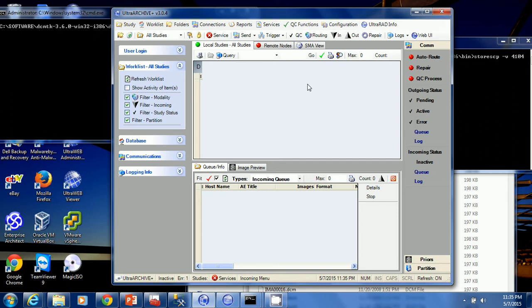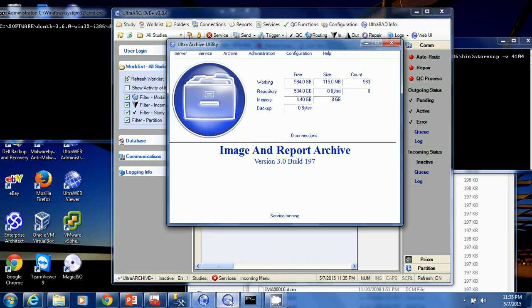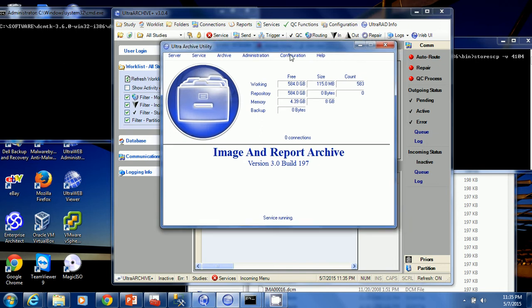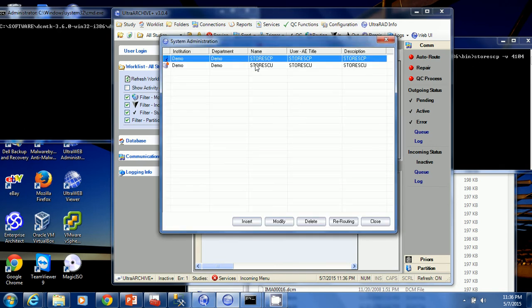which can add considerable latency to routing. So to work around that, or to make the routing a little bit faster, we have real-time routing. I'll show you how we configure that. If I go into this other dialog box, I still have my incoming nodes, so they're still here, although they're incoming and outgoing in this interface, but these are my nodes.